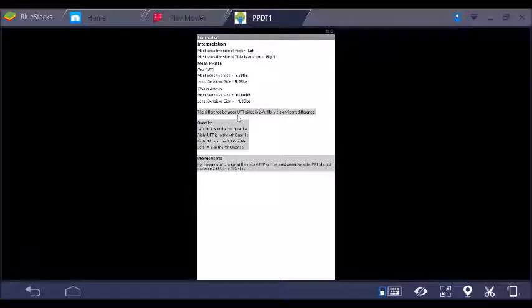It says the difference between upper fibers of trapezius, that's UFT sides, is 24%, or likely a significant difference. Based on what we know about the clinically important difference of these things, anything that's more than about 20% different between the 2 sides, we're going to say that that's probably significantly different. In other words, you could say the left side is probably clinically significantly more sensitive than the right side. Don't mistake this for statistical significance, but obviously we can't do that with just 2 tests.